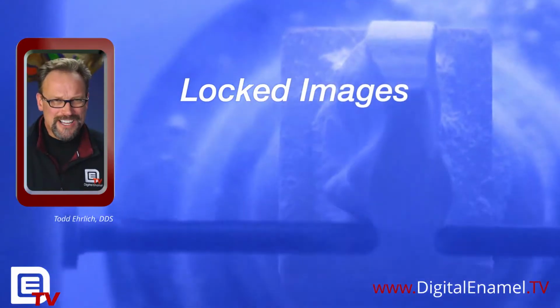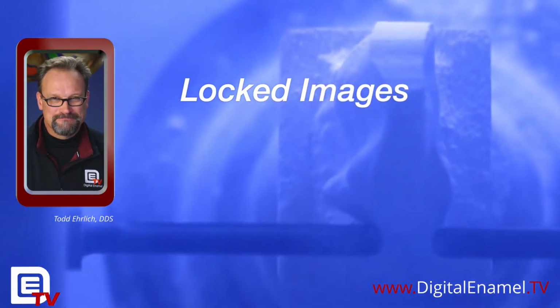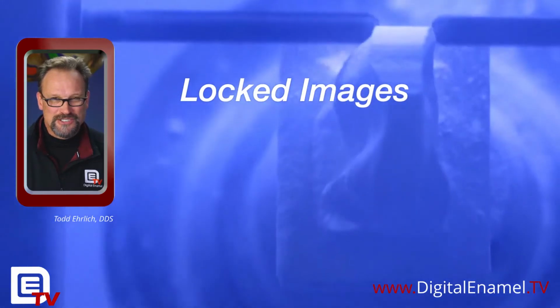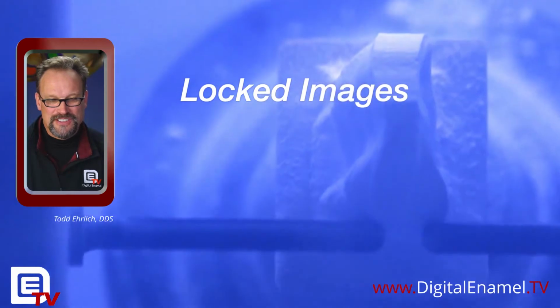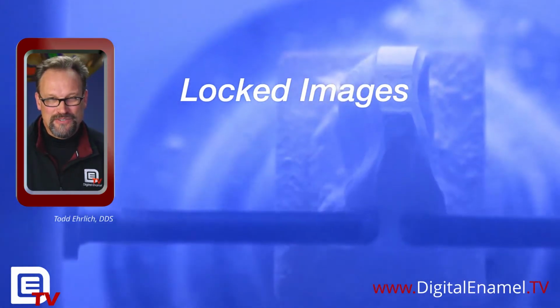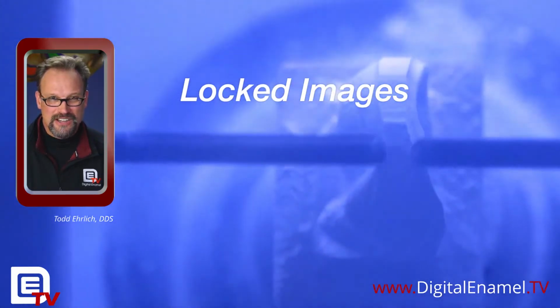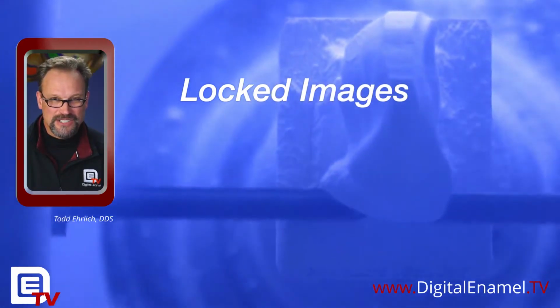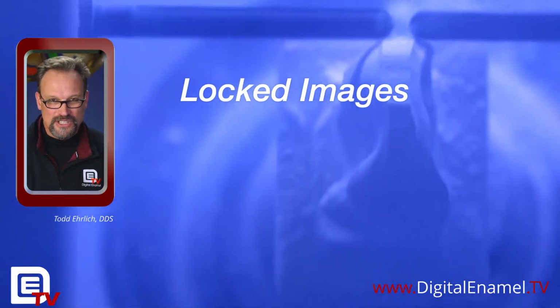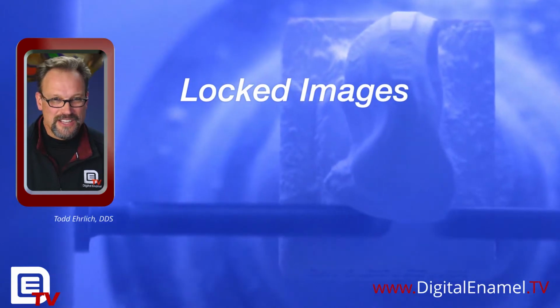Have you ever wondered why CEREC will lock the images? Well, our German engineers are very conservative and they don't want anything to get messed up. Usually whenever you go forward in the program or you save the file during the acquisition phase, the models will lock. Basically safety precautions so that nothing gets changed.